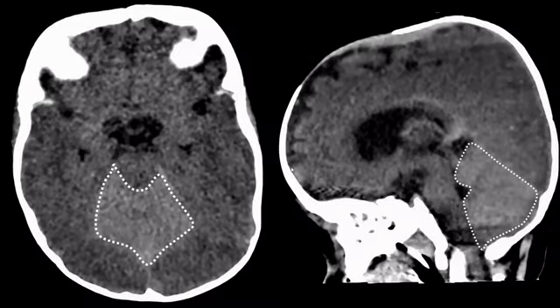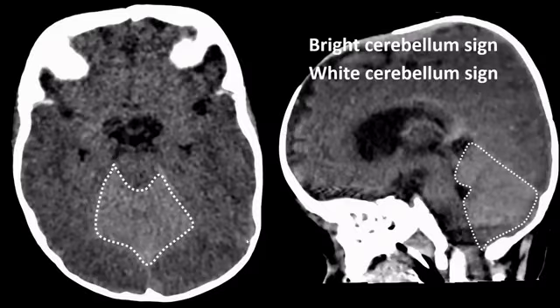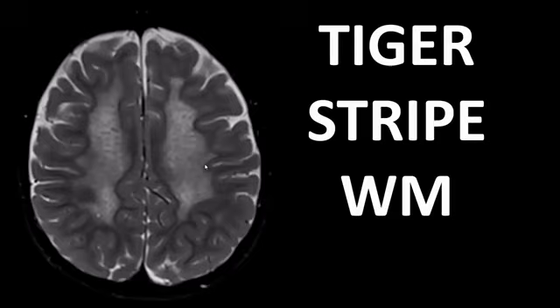Now, in the sagittal plane, we can also clearly recognize it. I think the sign is a bit less relevant nowadays for the diagnosis, but nevertheless, it's well known and is also quite often seen because this entity, unfortunately, is not that infrequent for neuroradiologists. Sometimes it's also called the reversal sign because the supratentorial brain looks hypodense and the infratentorial brain, the cerebellum, looks hyperdense.